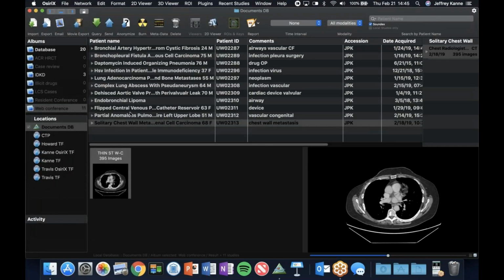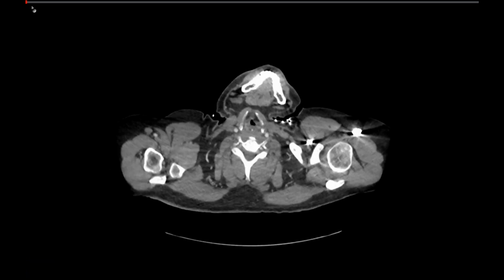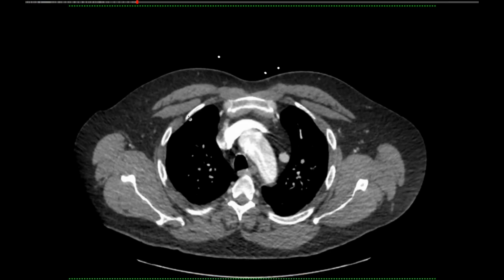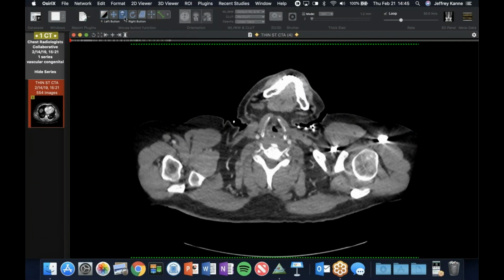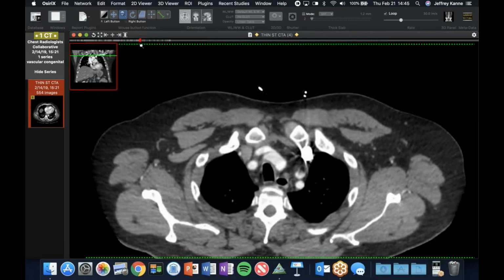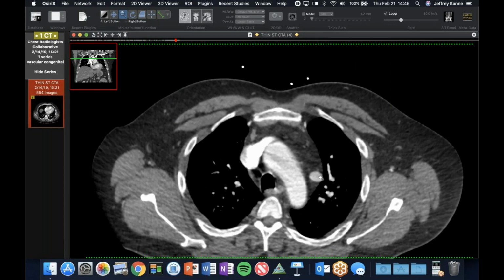Wow. All right. So this is another congenital case, and maybe I just have never noticed this in the past. Let me get my magnifying glass here, make this bigger. But this is a case of nothing exciting. This was just an incidental finding. We were reading a radiograph and saw the CT and noticed on the CT this vessel.